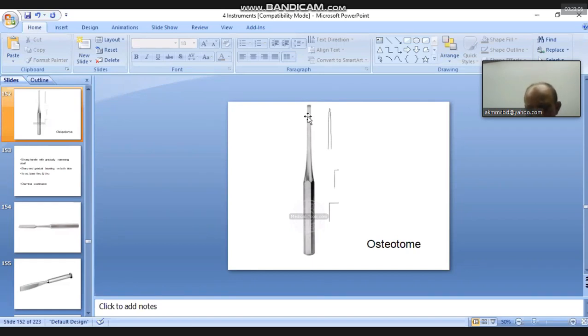Like anything, just you see we break the brick or break the stones or something like that. You see the working people, the manual laborer, they break all these hard things, something like one hammer and one sharp instrument, that is something like osteotome.